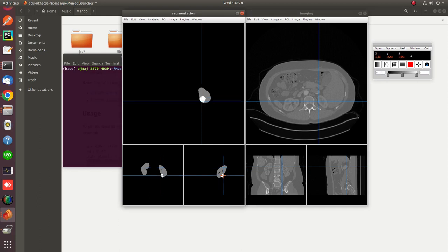Okay, when I click on the tumor portion, you can see in the window on the top right, this represents a second class. The first class is the kidney, and class 0 is the background. So your goal is to first segment the images, and thereafter classify into 3 classes.